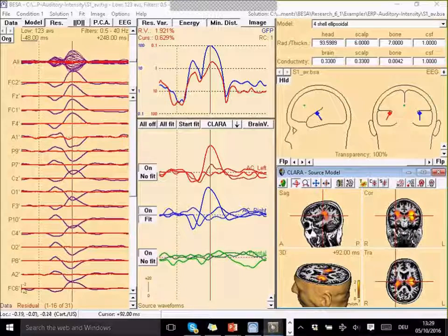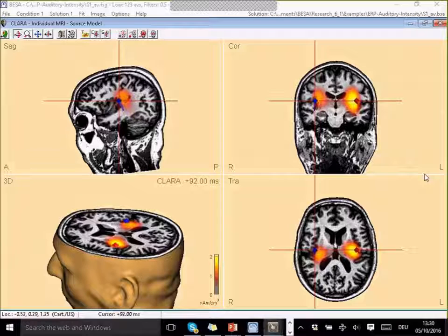So they will not be in the deep brain structures, and so this will already reduce our source space and make it a bit easier to find a focal solution compared to the volume image. And also we don't need to worry so much about the depth weighting.